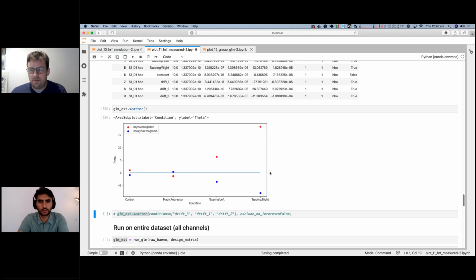There is one, Rob, indeed. It's related to having regressors in the GLM. When collecting data with the NIRx NIRS-2 system, there's the possibility to include an accelerometer to assess movement as a further potential regressor for artifact correction. Is this accelerometer sensor data already accessible in the MNE object when using the .snirf data structure?